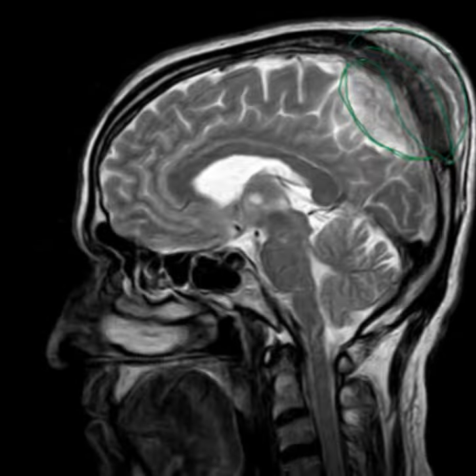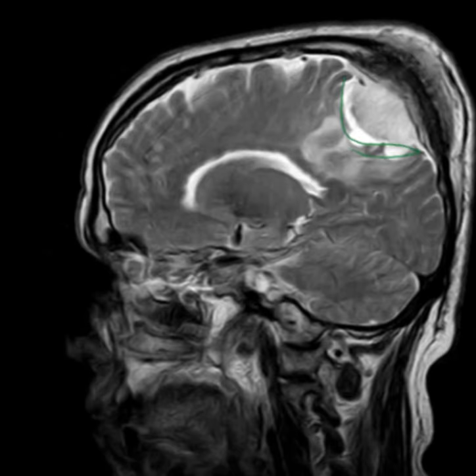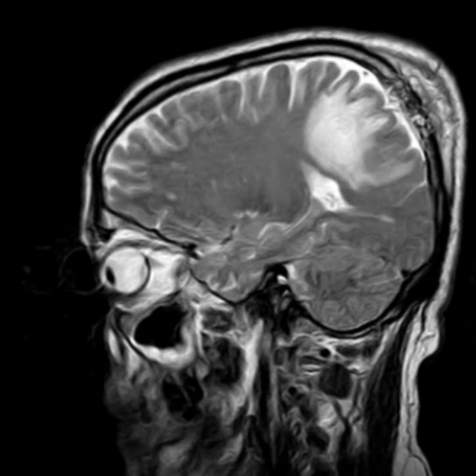This lesion is an extra-axial lesion causing mass effect on the brain parenchyma, both right and left parietal lobes, with a vasogenic edema. Good job. Very good job. So what do you want to do next? Well, I want to give contrast, IV contrast.